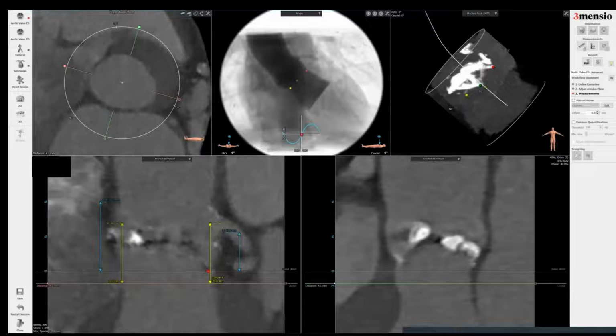Now, of course, you can go higher, lower. This is kind of like a more conservative estimate. And then what I do is I go measurement distance. Now I draw the box of 26 millimeter on this side.